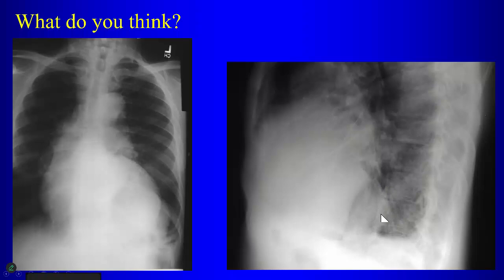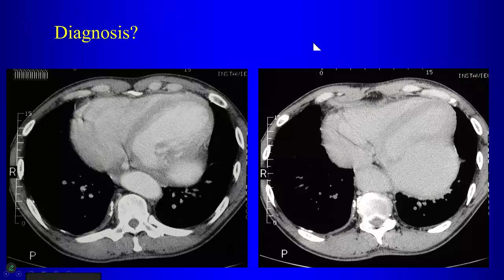So here you would be concerned about what? And what does the CT show? So how do you know that's a pseudoaneurysm? Location. Well, what's more important than that? The neck size, right? So the best way to differentiate a true aneurysm from a false aneurysm is the size of the mouth, right? Can you see the mouth in this case? Really? Not really, it's so small you can't even see the mouth, okay?